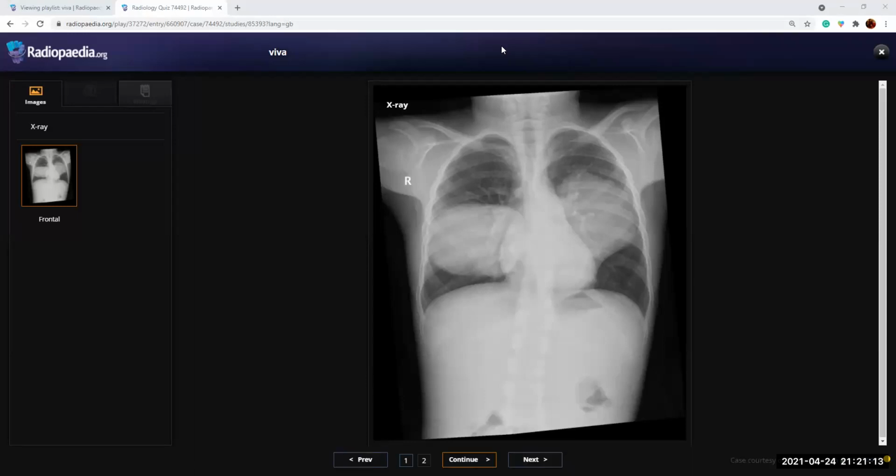Actually, I would like to take this further with a CT scan of the chest. I don't have a CT. I don't have any images further than this. Okay. Then, since it is an acute angle with the mediastinum, this can be a lung pathology also. Yes. If it is lung, what can it be? I'm looking for any. It looks like an airspace opacity, like a dense opacity, airspace opacity.